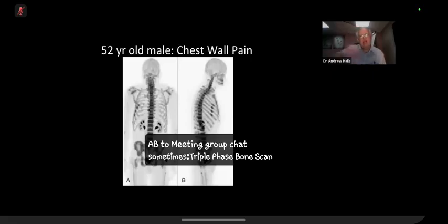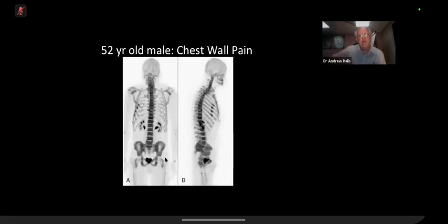And when you get them in contiguous ribs, those are rib fractures. But this patient doesn't need to have been run over by a bus. They may have fallen over. So somebody can present with chest pain, and it might not be obvious they've got fractured ribs on a chest x-ray, but this shows that it is in fact fractured ribs.